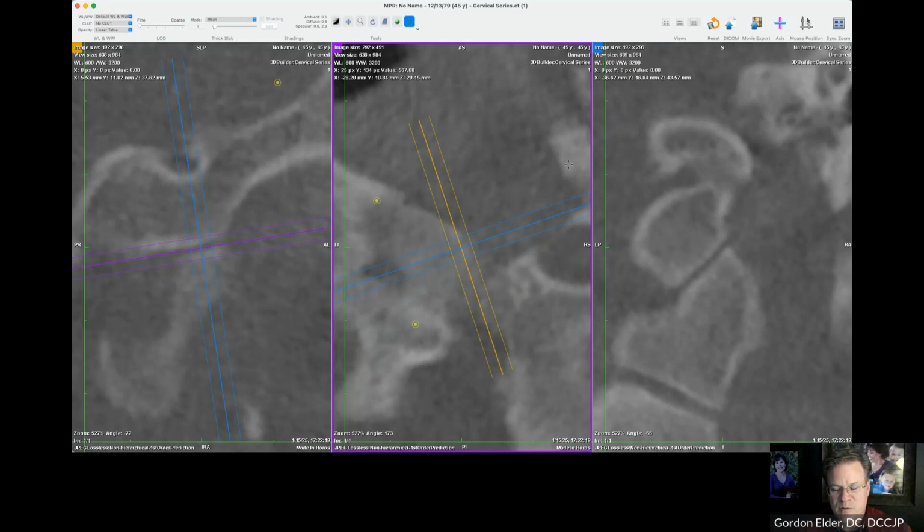We're going to do the same thing on the other side, but before I do that, any questions on this process so far? We've got one listing. Hopefully we find that the atlas is in juxtaposition or even on the other side, but you can have multiple, you have two joints. You can be misaligned on both joints. It can happen in one accident, but there's no rule that says people can have only one trauma, so that you can have multiple injuries in the joint, even ones that are opposite. They just won't show up at the same time unless the atlas breaks, in which case, hopefully they're not in your office. Or if they are, you send them out. No questions on this? Okay.